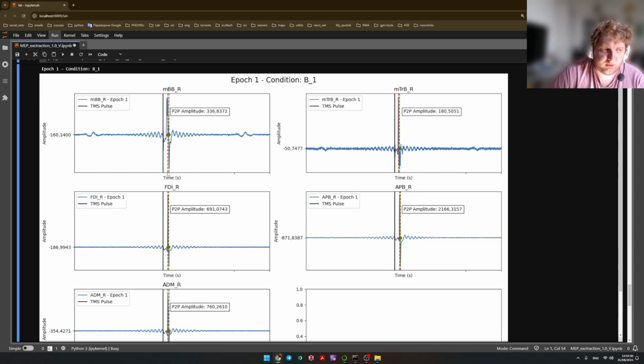The red and green lines are only timestamps for the maximum and minimum. As you could see, for example, I don't know if this red dot needs to be here. I did something with my code because I tried to debug it with other stuff.